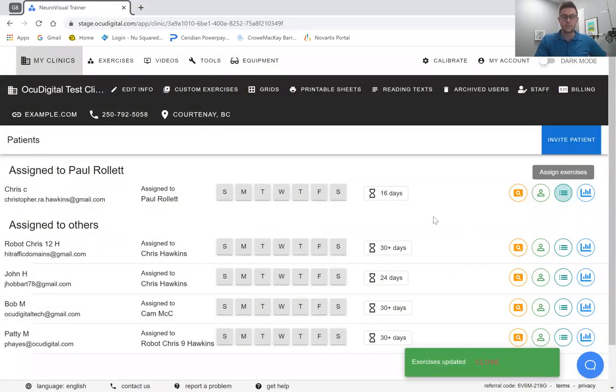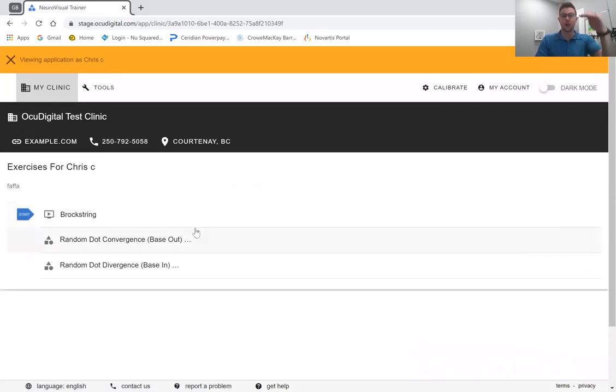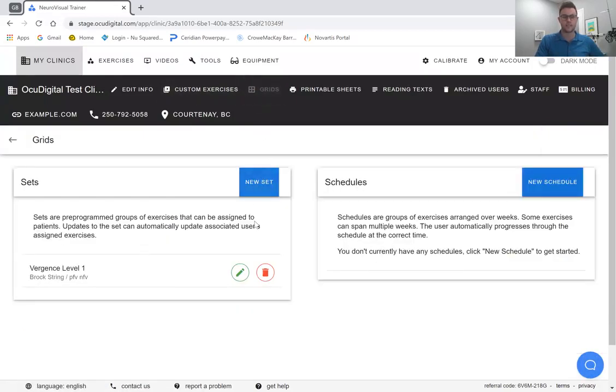So now that you've saved these exercises to this client, you're going to go into their file and you'll see they've been assigned all 3 of those activities. So you click it once and they've got the full set available to them. It just makes organizing and sending activities simpler, and in particular in the area of sending groups of activities.